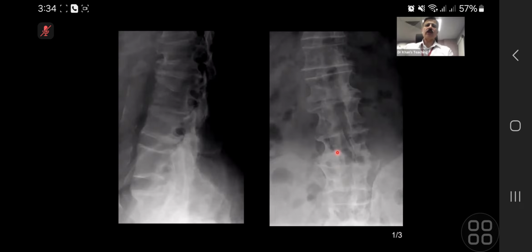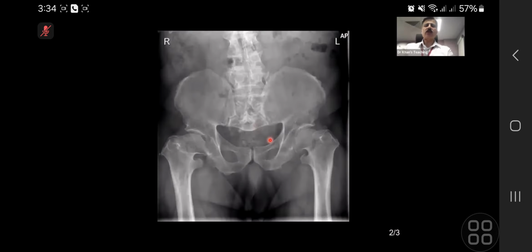That's a key finding to diagnose it. It can have posterior scalloping. These are secondary degenerative changes. We know that in achondroplasia, secondary degenerative changes will occur. This per se is a very, very good exam film where what you can see is what we call a tombstone appearance of the iliac wing, and with that epiphyseal abnormalities, etc. Champagne glass pelvis is the shape.